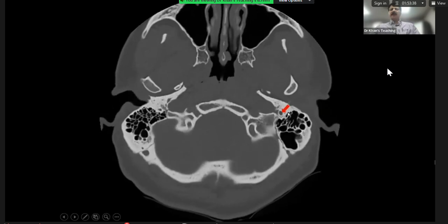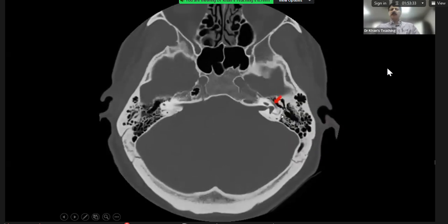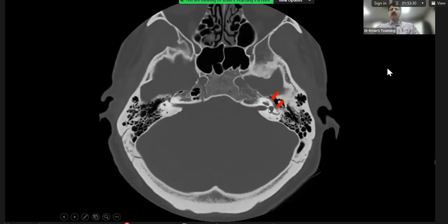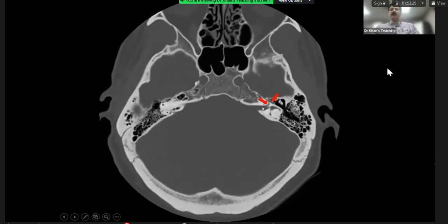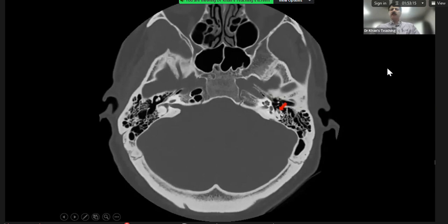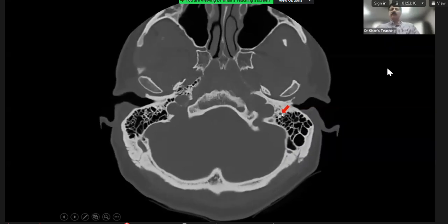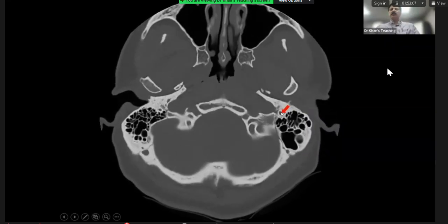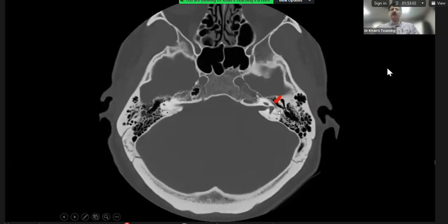So let's track the facial nerve once again. So this is the cochlea. We go superior to the level of the cochlea, and we can see that the nerve is coming from the internal auditory canal, going anteriorly, and then the tympanic portion goes posteriorly, and then it becomes a ring because we are seeing it end on. It is descending down, and ultimately it goes out. Let's see a few landmarks surrounding it, but we will not overwhelm ourselves.